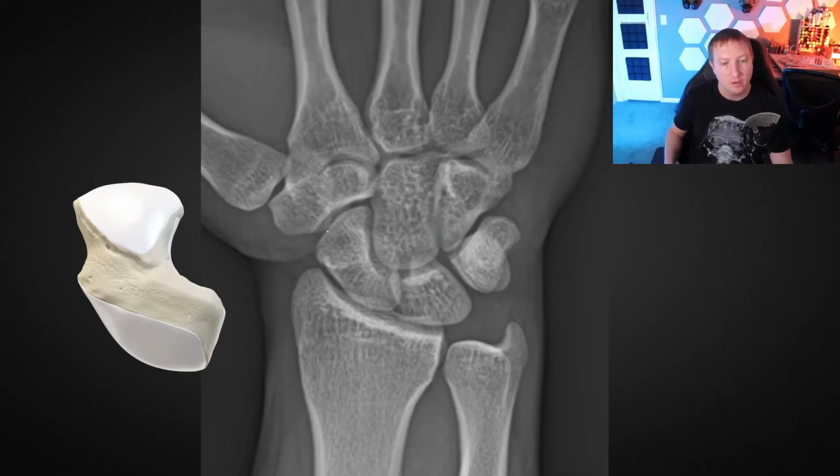And one other thing I forgot to mention was the distal pole of our scaphoid here makes a joint with our trapezium and our trapezoid. So the fact that there are 3 bones involved in this one joint, that's called the scaphotrapeziotrapezoid joint, or triscaphe joint.